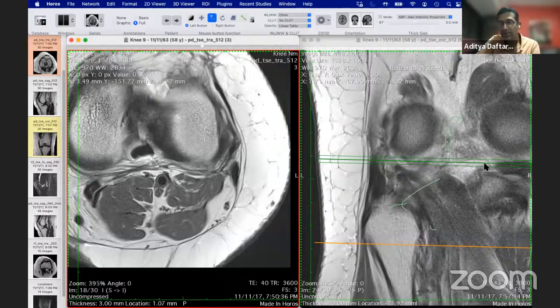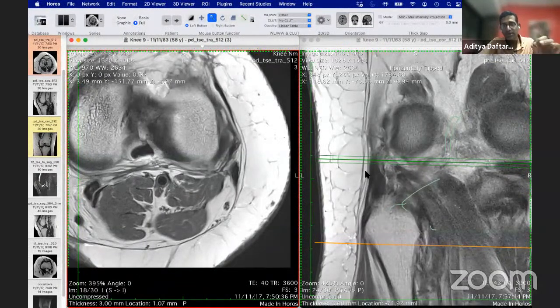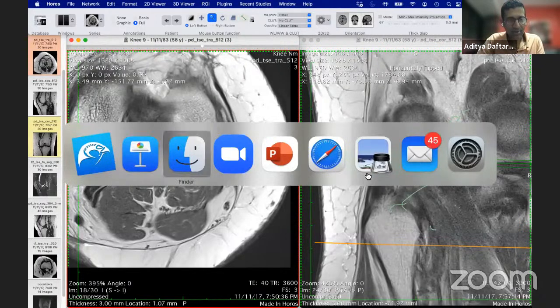The thing that we look at normally for ACL ganglion cysts is you just see a more cystic appearance to the ACL, and you see this mucoid degenerative appearance. We normally classify these into 3 ways. One is purely mucoid, when you see this striated appearance, which is just a thicker, bulkier ACL. When we see the striated appearance along with a little cystic change towards the femoral attachment, then we'd call that, let me just show you if I can do this 1 second.